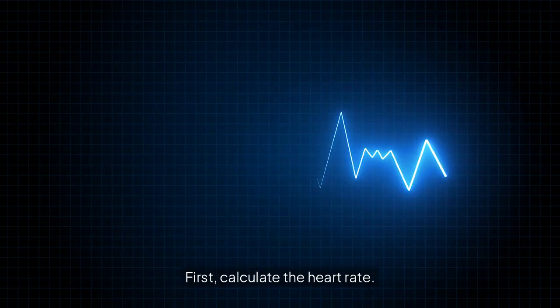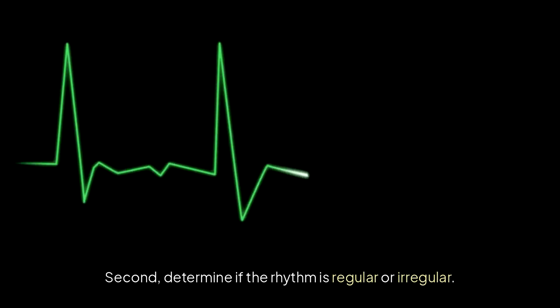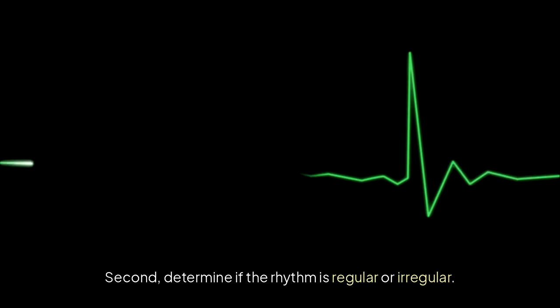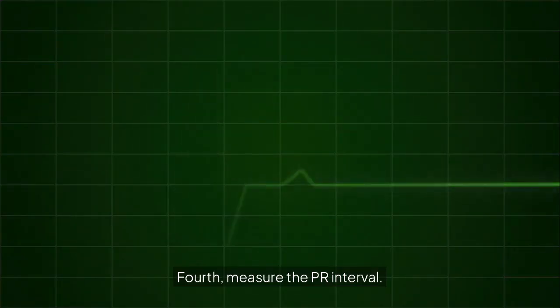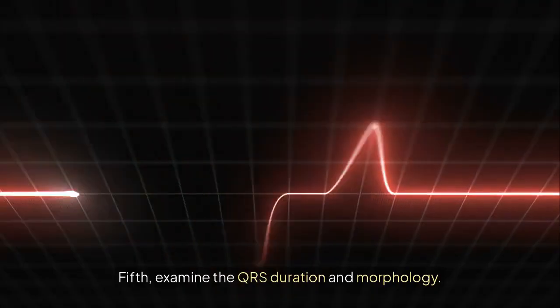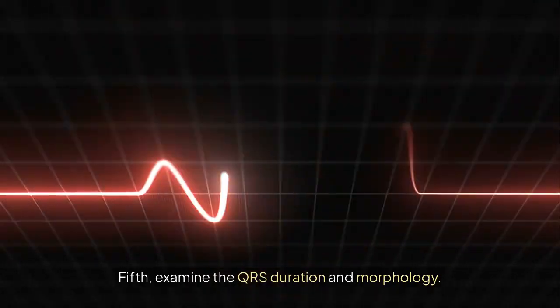First, calculate the heart rate. Second, determine if the rhythm is regular or irregular. Third, check for P waves and their relationship to QRS complexes. Fourth, measure the PR interval. Fifth, examine the QRS duration and morphology.